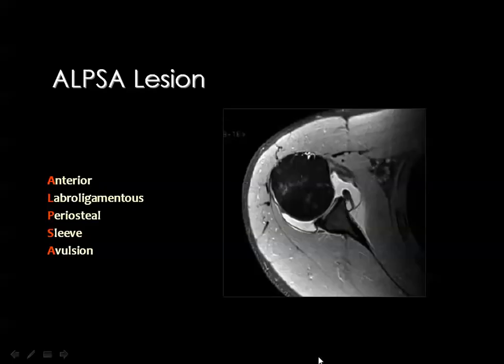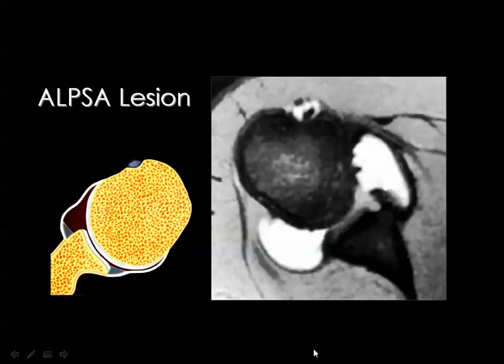Of course, you may appreciate that these lesions are difficult to evaluate without the help of MR arthrogram. Also, if you see this appearance, you consider ALPSA as well.